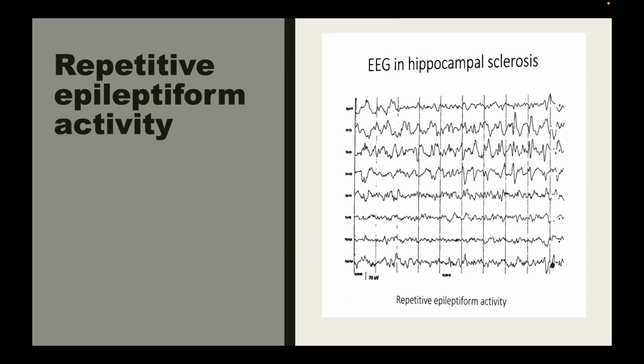This is an ictal event because this is the same epileptiform discharge repeating itself. If there is a structural abnormality, the repetitive discharge may be constant or more recorded during wakefulness and sleep. So we should monitor the patient with video monitoring and correlate with the clinical events.